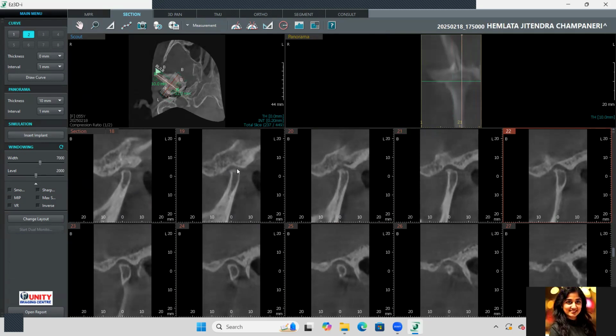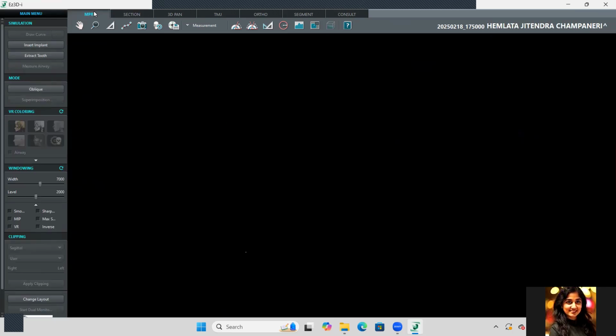You can see there's a chance of resorption also. And you can see this cyst, Ely's cyst we say, osteophyte appearance. The resorption starts with formation of a small cyst, a resorptive cyst actually, in the superior border of the mandibular condyle.